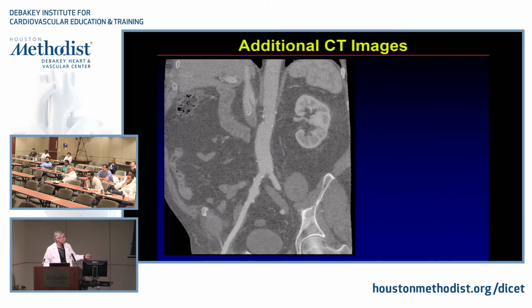As you can see, this was an aortic graft that he had done. He never even knew. He couldn't even tell me what exactly he had, but he said he had some kind of peripheral vascular disease. So when we did the CT scan, we went ahead and did his belly too, and he actually has a very nice aortic graft from here to here for an infrarenal aortic aneurysm that he had in the past.